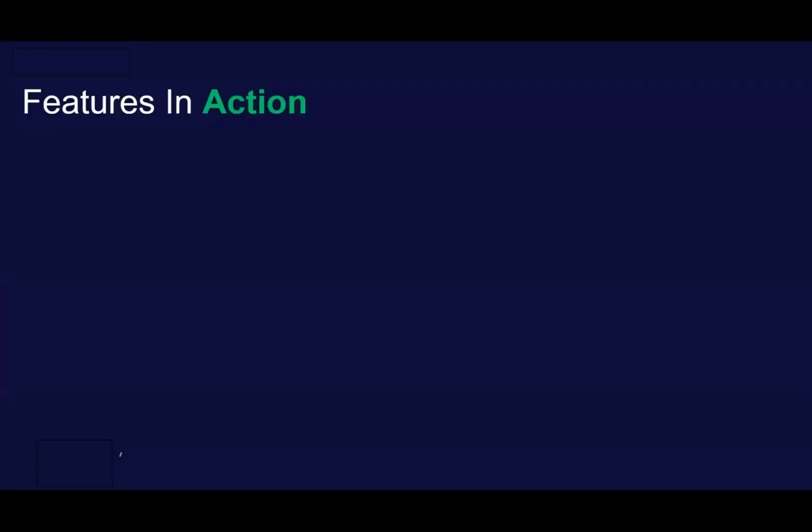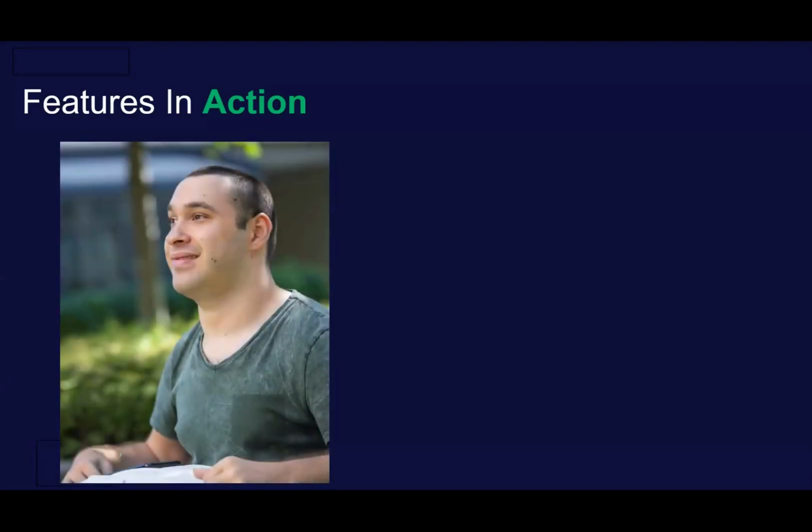So let's go back to our 2 communicators that we talked about. And let's check in with James. So James started using TD Snap Express with one of his favorite themes, entertainment. He loves watching movies and TV shows, so he identified symbols from his favorite shows and movies and started communicating about them right away. With that type of success, he was actually more motivated to explore other themes.